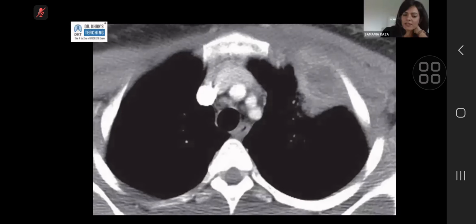So this, I think, is just the slice that it's at. It looks like there is a rib, that rib is missing. It's actually not, but there is clearly extension outside going into the subcutaneous tissue. Can anyone tell me what that's called when the empyema extends into the extrapleural tissues, then into the chest wall? Yeah, perfect. That's absolutely right. That is empyema necessitans.